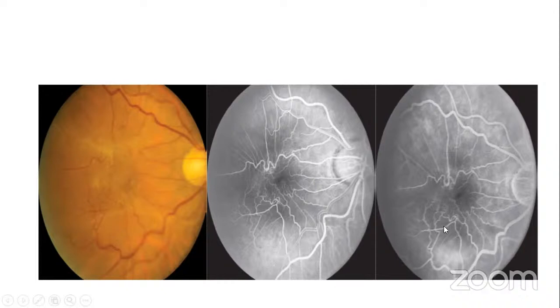Okay. Now, what you'll find here is that there's some form of hyperfluorescence that is abnormal, but look at where it is. Here. So the vessel here, you have a hyperfluorescence and some form of leak here. So these are abnormal. Okay, look at this other side. The patient has diabetic retinopathy with this membrane pulling, epiretinal membrane. Okay.